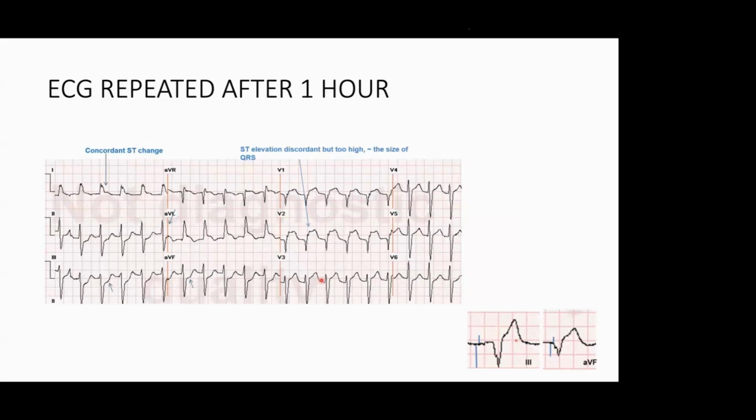You don't have to mark up everything about the Sgarbossa criteria. There is a modified Smith criteria that makes it very easy to diagnose myocardial infarction in an LBBB patient. Can you tell the findings? I think you already marked them in the ECG.